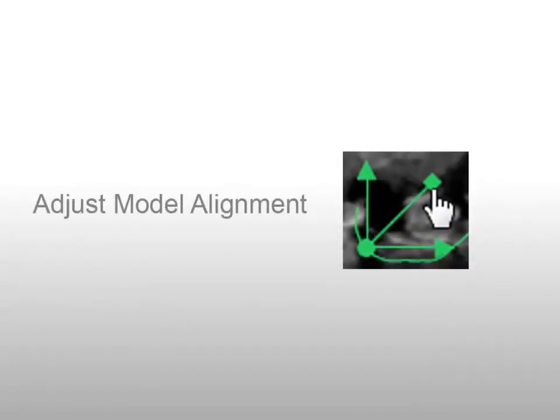You can manually adjust the automatic alignment of a model with a patient volume to refine the result based on careful analysis of the anatomical details. The virtual tools in CS3D imaging software are intended to enhance and simplify implant-supported restoration. No algorithm, however, can replace the dental practitioner's experience and skill.